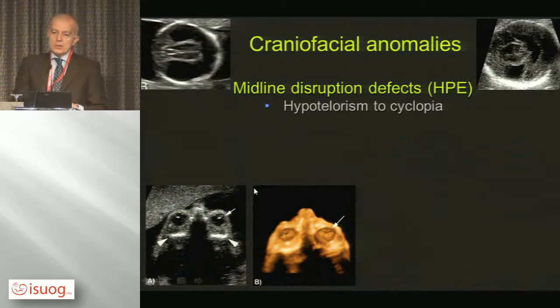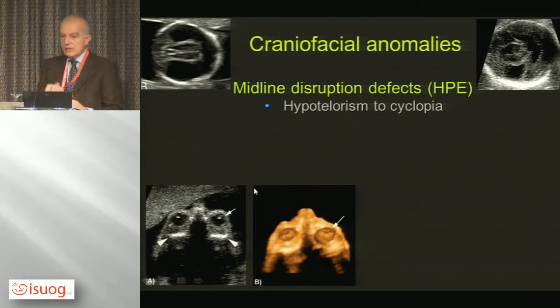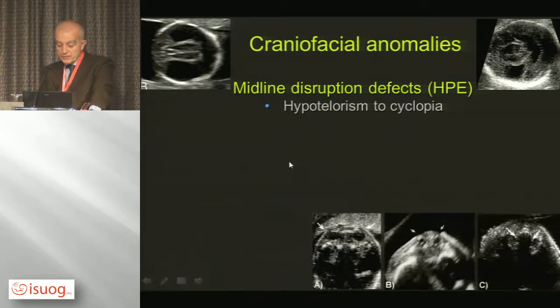Let's set aside all midline abnormalities at all levels, because they are part of the holoprosencephaly sequence, and so we expect that you will have already assessed the brain and found the major abnormality, which is the holoprosencephaly. So all the different midline abnormalities of the fetal face are less relevant for our everyday practice, because usually you come to evaluate the face after having assessed the brain properly. So in this case, you will have all degrees of hypotelorism, which in the overwhelming majority of cases are associated with holoprosencephaly.